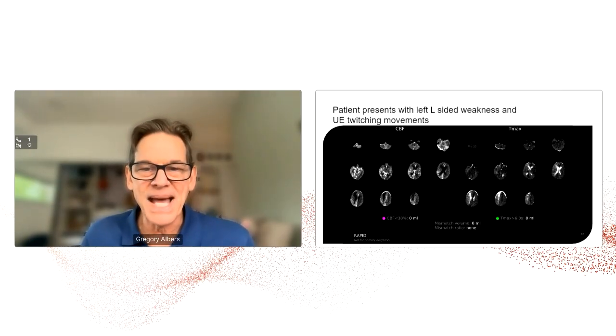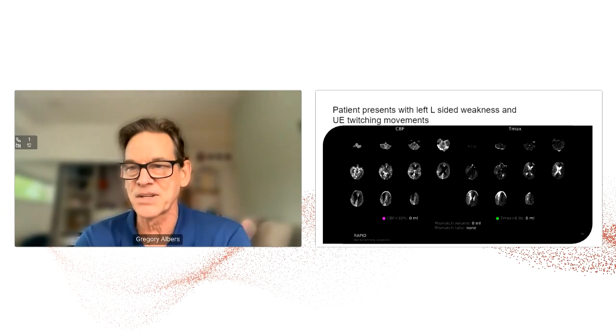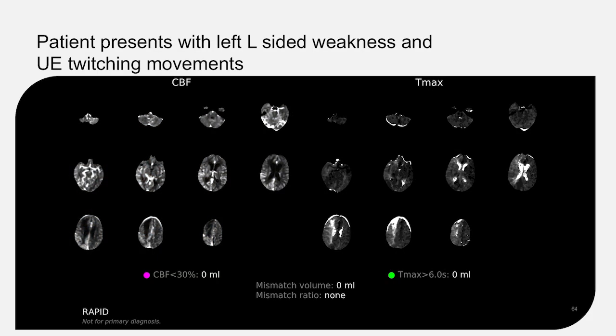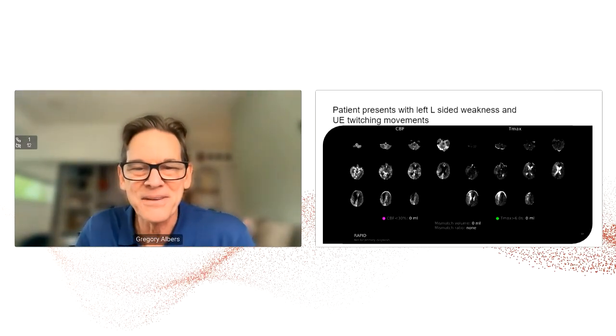So now if we go back to that Tmax map, we can see the reason that we have a brighter right hemisphere is because this patient has a right carotid occlusion, which they have compensated to some degree for. But at the time of it, it caused a big infarct in the right frontal lobe. So that's why there's that very bright area of white in the right frontal lobe. And then we also suspect that we're going to see some movement on the movement column because we've got that sort of white pencil line along the front of the brain.